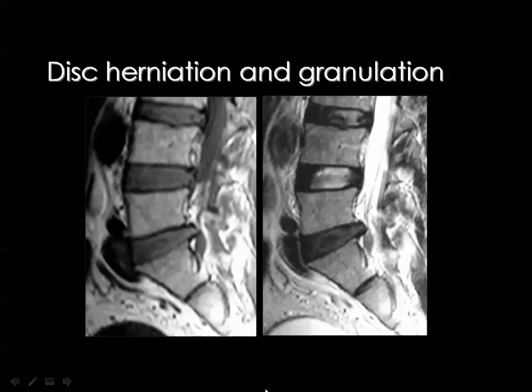Of course, this diagnosis is very important, so that you may say to the surgeon, don't operate. This is not a massive disc herniation. This is just a small disc herniation and is surrounded by granulation tissue which will regress if the patient is adequately managed conservatively.